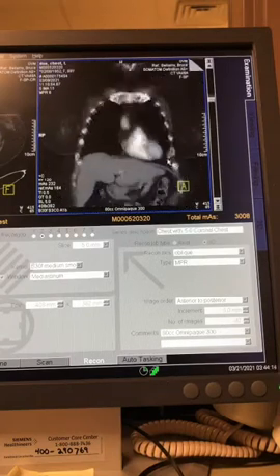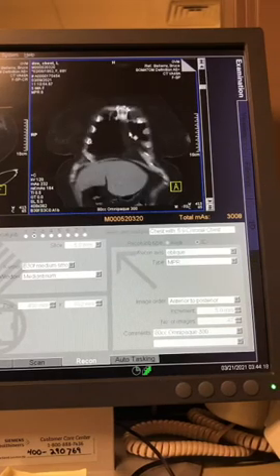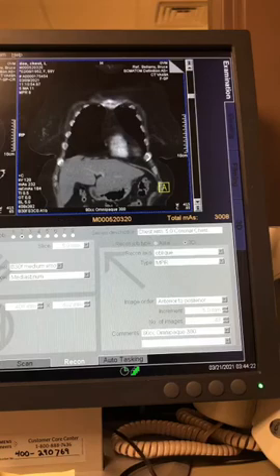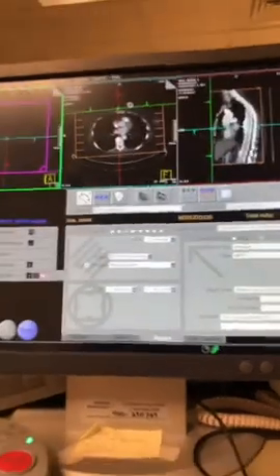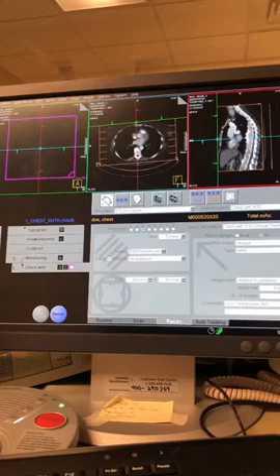Okay. Anyway, so again, be familiar with the anatomy, but these are beautiful pictures. We can throw this thing in a lung window, but look at that sternum, all right? You'll never get that on a radiograph. It's freaking gorgeous. But say we wanted to do a sagittal real quick. I'm selected here. I still have the raw data for this, so I'm gonna add a reconstruction. It's gonna take me to our 3D reconstruction window here. I'm gonna back out so you can see it. So this is my sagittal image.